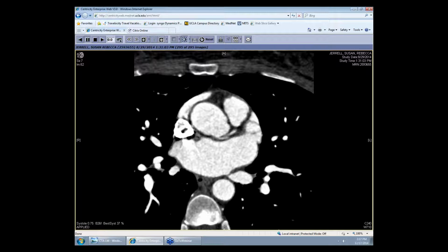Right, so that's why he did the intravascular ultrasound. It looks to me like it is elliptical, not circular, but not very compressed, at least at rest. But with stress, the patient was having symptoms. So Aksoy sent this patient to surgery.